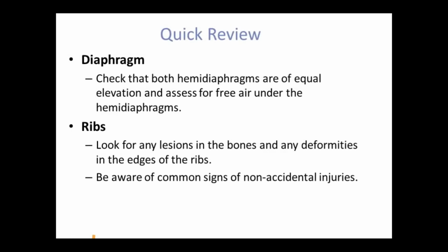For the diaphragm, check that both hemidiaphragms are at the same level and look for free air under the hemidiaphragms. Lastly, look for any lesions or deformity in the ribs and be on the lookout for common signs of non-accidental injuries.